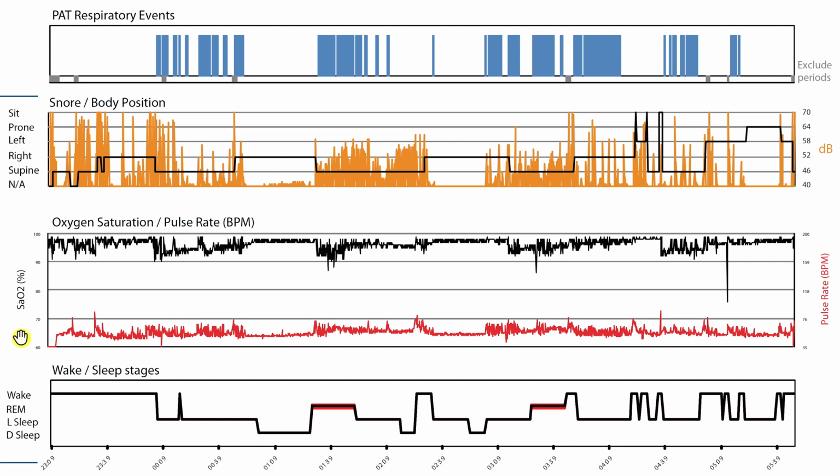So this graphic is oxygen saturation, which is this black line. You can see there's little numbers here on the left. This is 100, 90. And this is helpful, but it's also kind of not helpful. I really like to look at oxygen saturation on a very small time frame because it allows you to extract a lot of context. When it's zoomed out like this, you can see macro patterns, and you can definitely glean important information, but it's severely limited in my opinion.